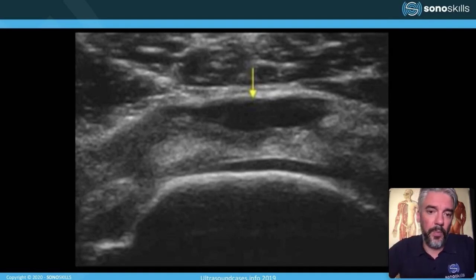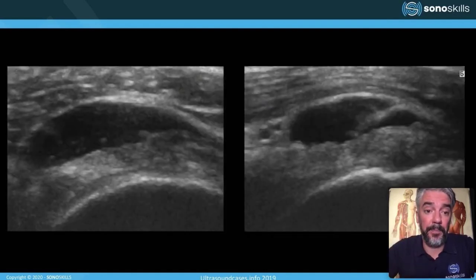These are easier to diagnose, and with higher accuracy, compared to an articular sided tear. So bursal sided tears are easier to diagnose and they also have a better prognostic outcome.